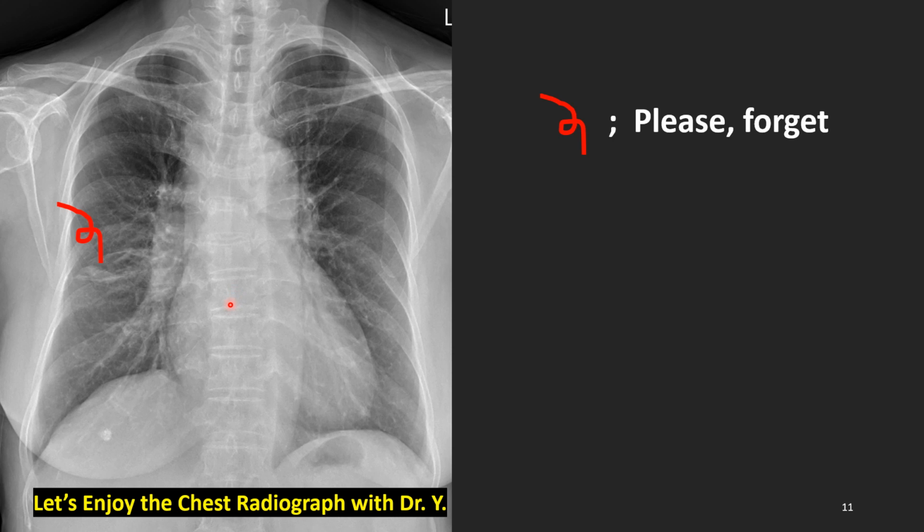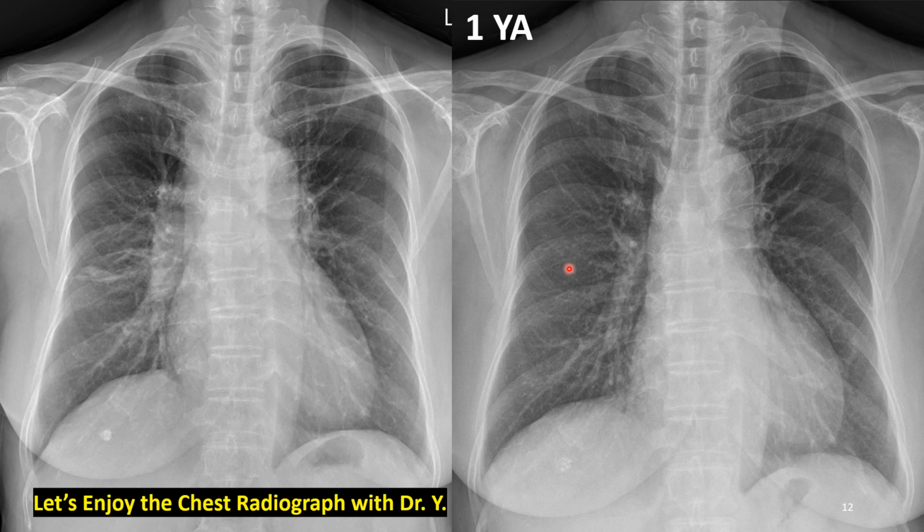Please look slowly, deeply, thoroughly. What's wrong? You got something? Okay, let's go to the next image. Last year, she was like this. You find the difference? Of course, this nodule is a metastatic nodule.